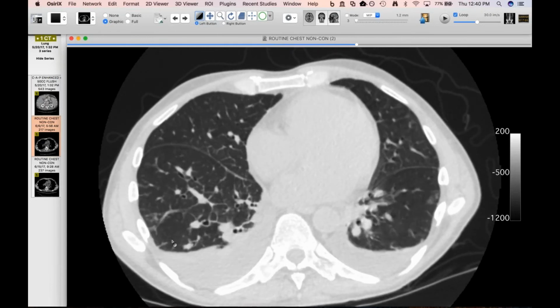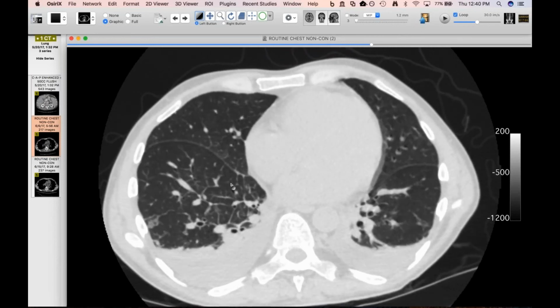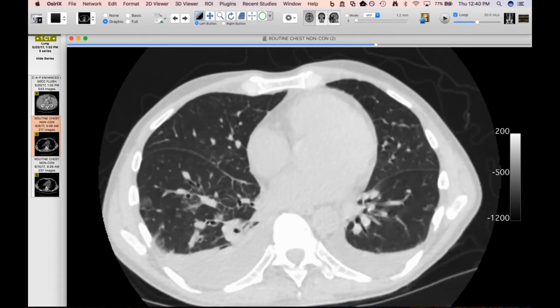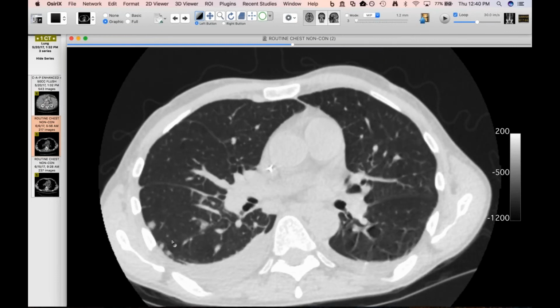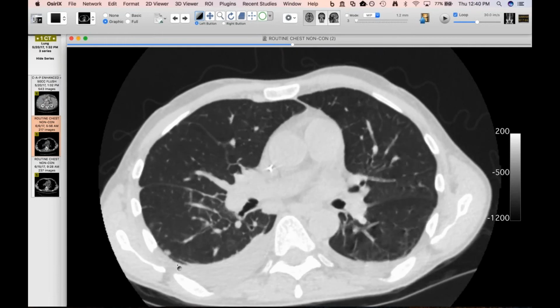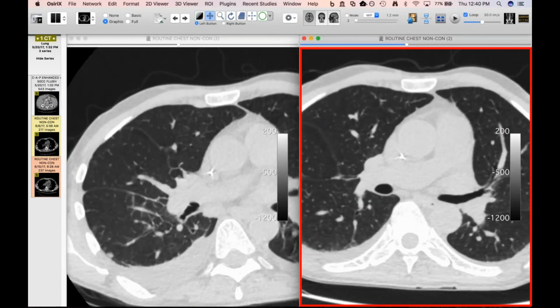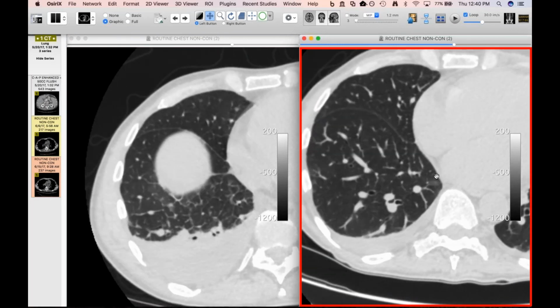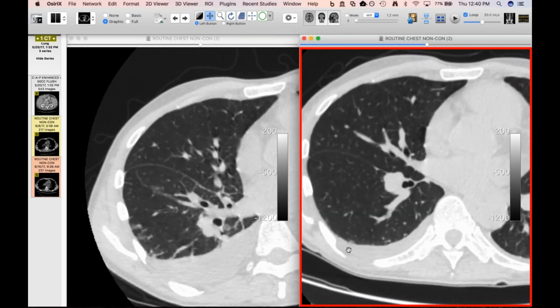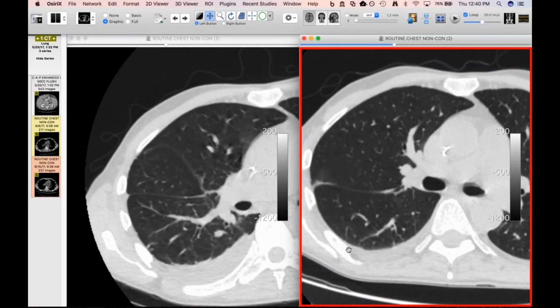It looks like little nodular septae, but some of them aren't clearly associated with the septae, like this one here, and there were a few higher up. I'm sure Howard knows where I'm going with this, because this guy clearly has a little bit of volume on board. These are really peculiar. And then we just saw it today. It was differentiated as edema, and the person who read this wasn't sure what else was going on. But now today, they didn't treat him for infection, and his edema's gone, and these little nodular things are gone. So I think these are all just little lymphatic pearls or venous lakes or septal lakes.